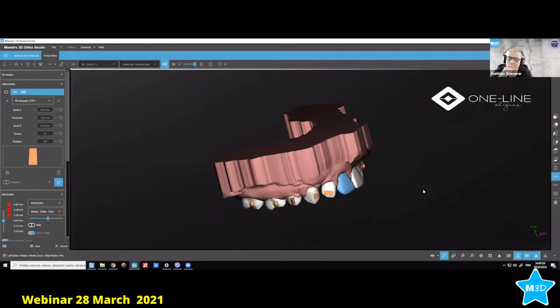Yes. So actually, if you want to ask me, for tipping, for smaller teeth, this is a better attachment than the yin yang one. Yes. And before, I tried also putting the same attachment vertically. I tried, but it doesn't work. Why? Because you are again in the middle of the tooth, which is not good. You have to be not in the middle of the tooth. You have to be on the sides of the tooth, right? So this is not a good attachment. You have to be here. You have to be down.